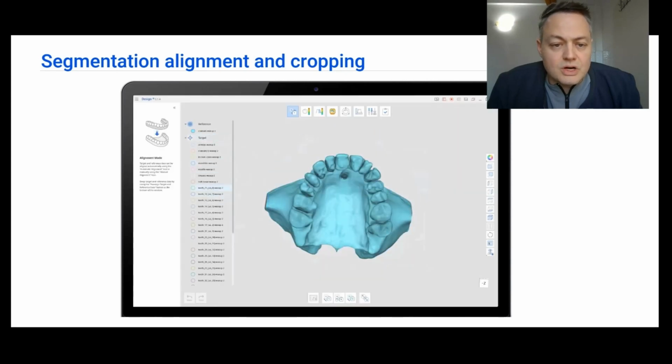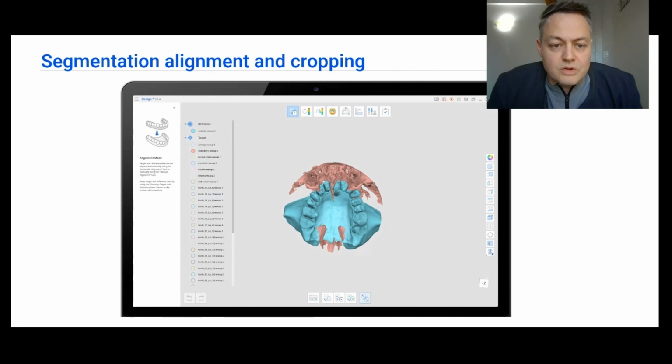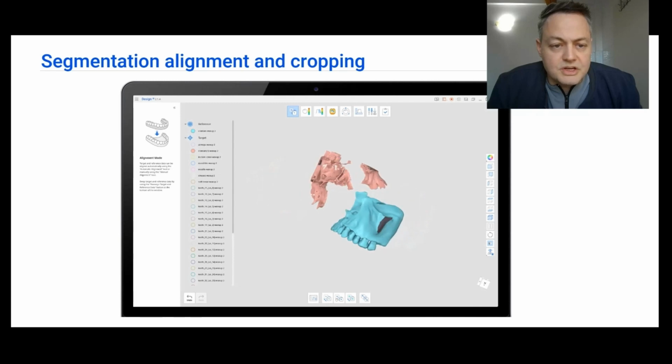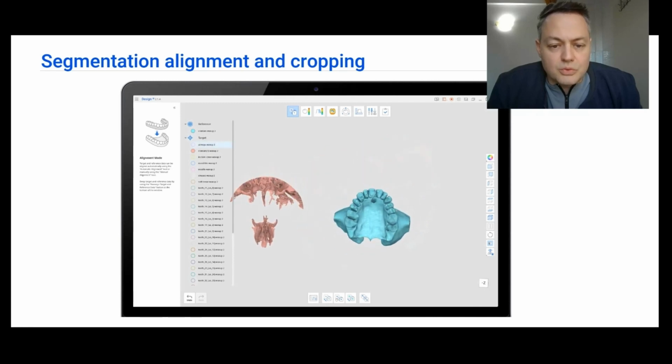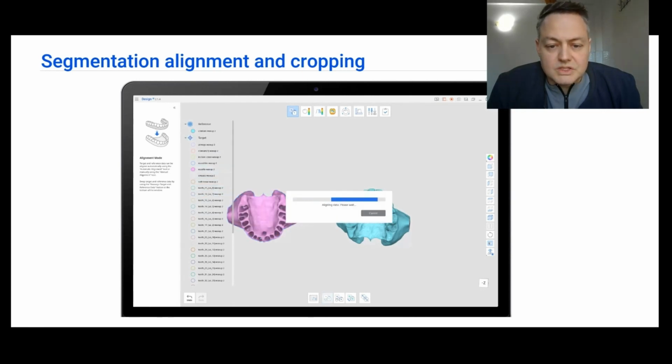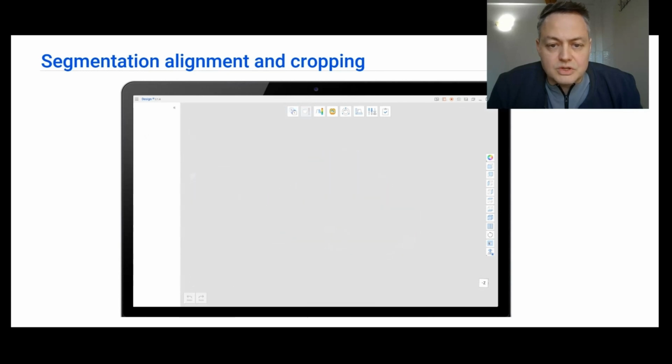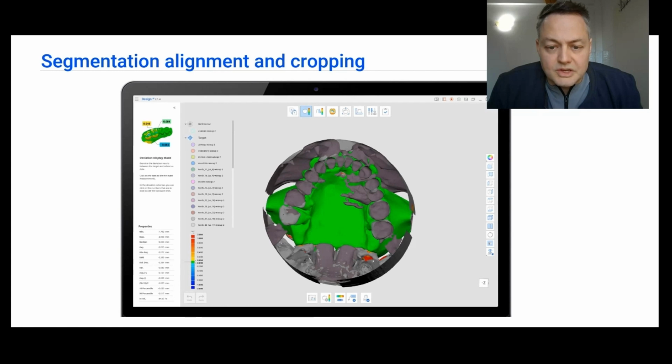And we are going to align the maxillary bone from the second group with the third group. You'll see here, this is going to be possible to align automatically because it's the same bone, the same segmentation. Let's see, automatic alignment. We check the fit. As you can see, it's going to be perfect. It's going to be completely green.